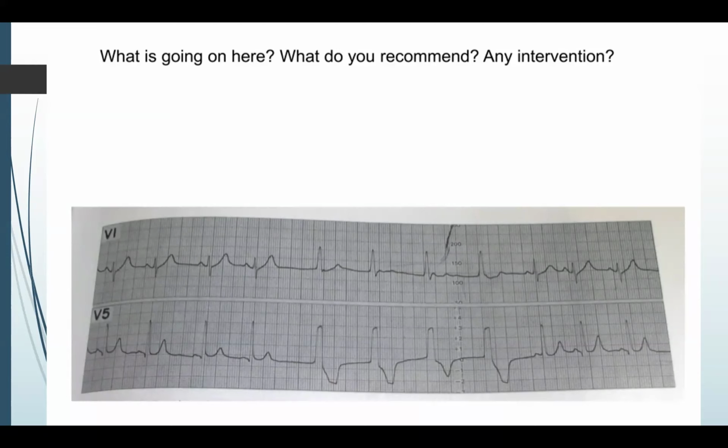Is it faster or slower than the base sinus rate, do you think? I know it's hard because you don't have calipers on the screen, but I think through your eye you can guess. Maybe a little slower. Maybe a little bit slower. So I agree, it is ventricular, and we know it's ventricular. Why do we know it's ventricular? Well, I'm not seeing any P waves. Right. And what else about it? Wide QRS, it's completely different than the sinus.